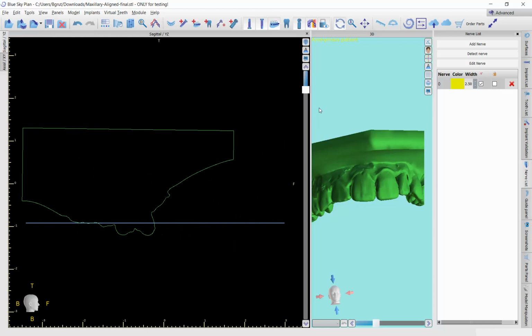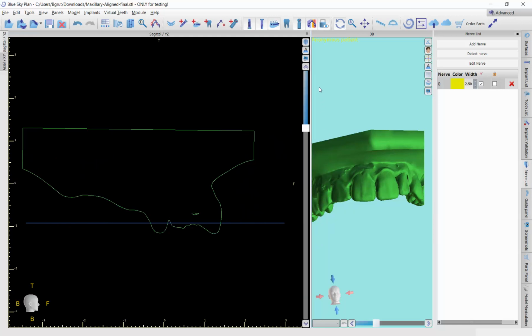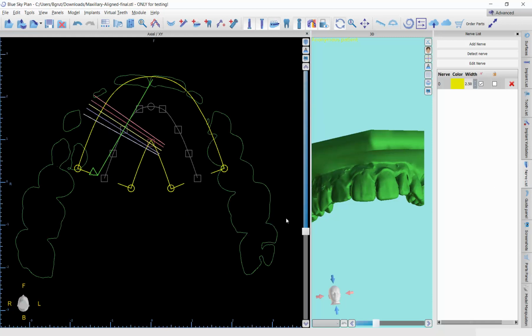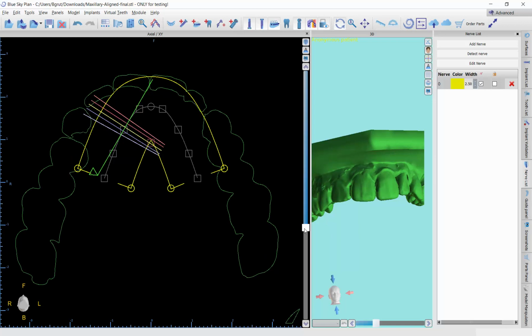So that's pretty good. And if I found that the posterior teeth were much farther down, I would then tip the model back the way I just did earlier. But it's not, so I think we're good. So I'm going to close this out, and now I've got this view. Now I'm going to go a little bit lower, right about there, we'll say, and let's see how we can draw our... we don't need to view this, so I'm going to turn this off right here.